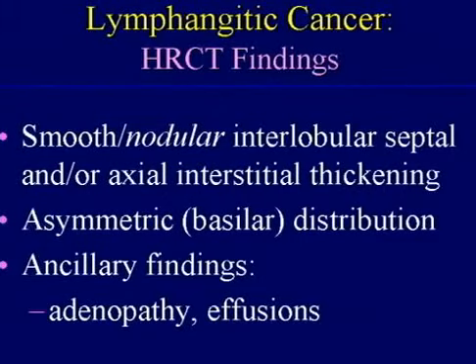So, we're still on that one edge of the algorithm where we're talking about lymphohematogenous disease, and we're on the whole way off on the left. And I said all of that's going to be sarcoid, but we'll talk a little bit about lymphangitic cancer because it involves the lymphatics. It's a perilymphatic disease. But it doesn't look anything like sarcoid.